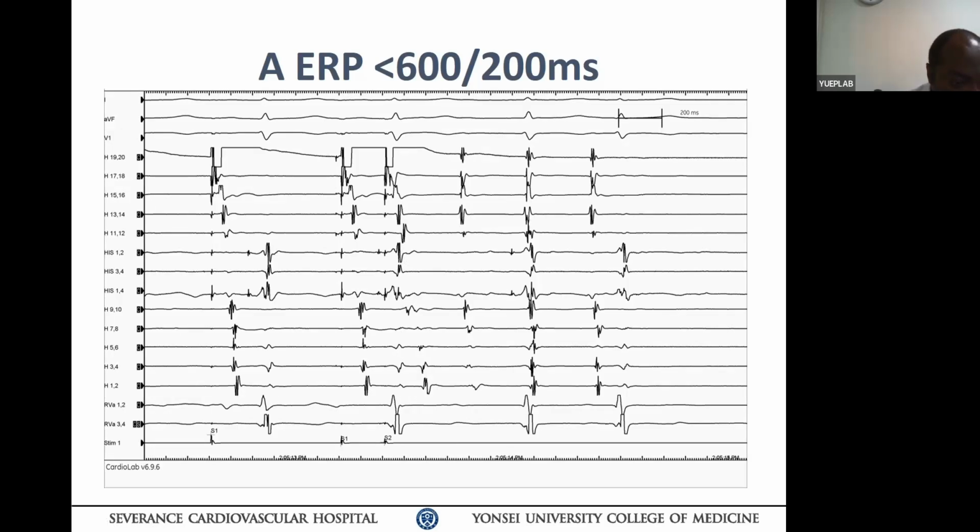You have a 3-beat, pretty similar, but not quite similar. Especially 3 beats, ectopic atrial beats, or non-sustained AT, because the rate is slightly irregular. Isn't that so? Yes. So it could be some sort of non-sustained atrial tachycardia. Could be some of those. Anyway, also the CS activation pattern changed. That favors probably a non-specific response.